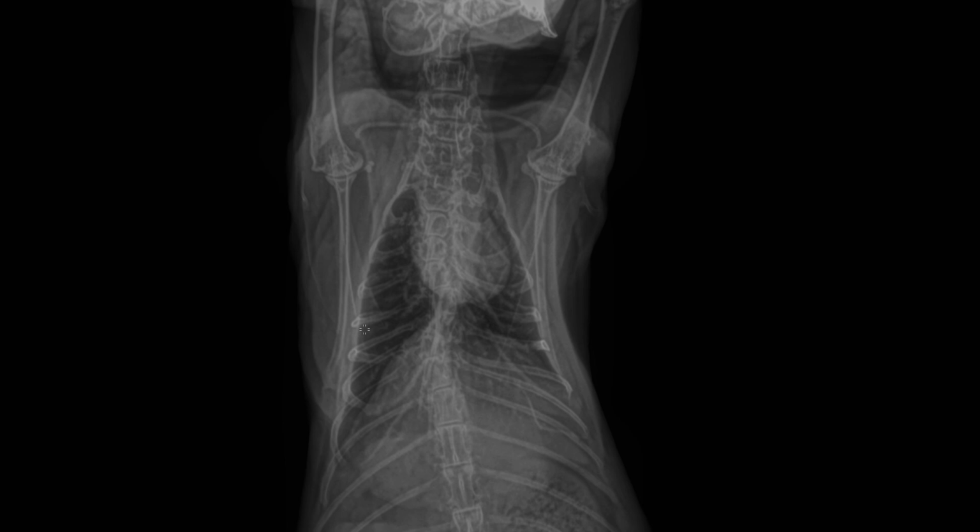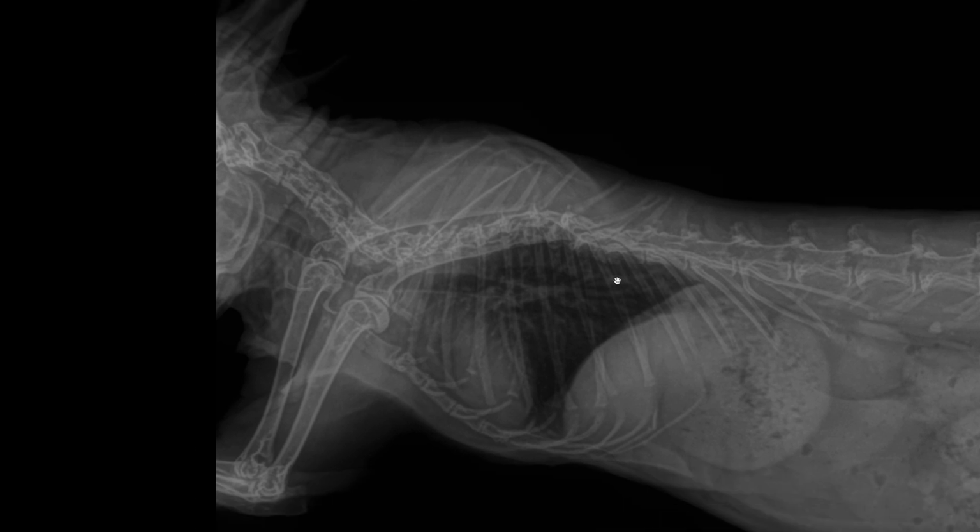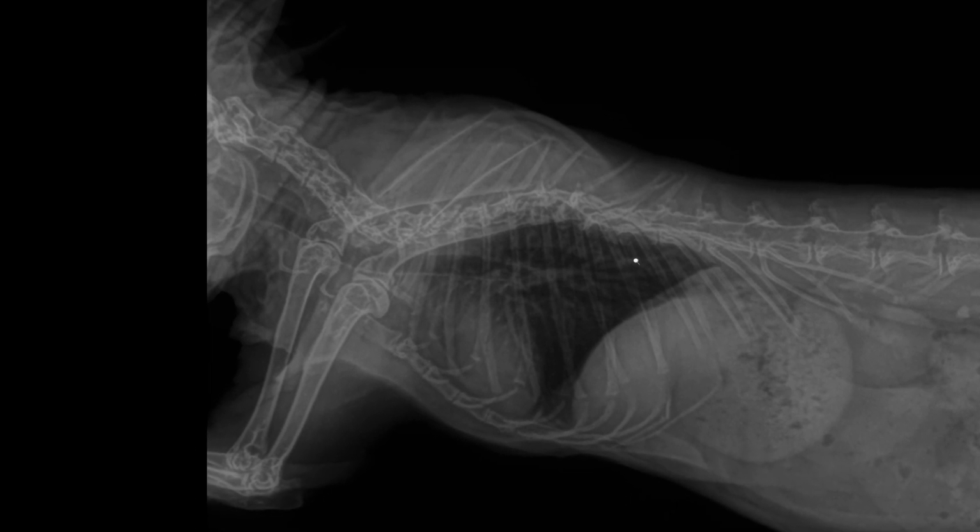Now, looking at the shape of the vertebrae at the level of the deviation, you may have noticed that the vertebrae become shorter and wedge-shaped, with ventral margin that is narrower with respect to the dorsal margin.